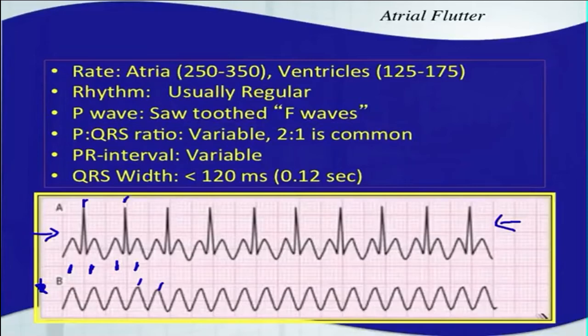So that's very common. I'm just quickly showing you this atrial flutter rhythm, but we're going to have to revisit it because it's such a difficult one for a lot of people to identify. And here's why. A lot of times people, especially with these 2-to-1 flutters, will see this first one here as a T wave, and then this one as a P wave, and they'll think it's a sinus tachycardia. That's very common to think, but it is an atrial flutter, and the way that you identify it is by looking at many, many examples and noticing that you have to cover up those QRS complexes sometimes and see that sawtooth pattern.